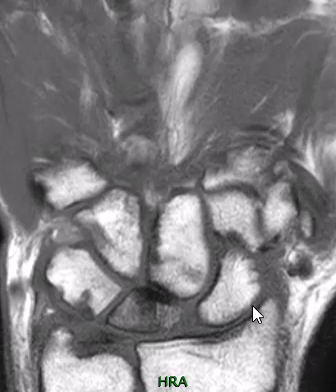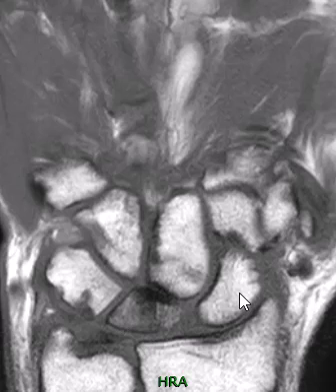And here is the lunate bone right here. So the scaphoid bone, lunate bone, triquetral bone. Here's the distal radius. Now, a lot of times we see the lunatomalacia associated with an ulnar negative variance. An ulnar negative variance is when the ulna is too short relative to the radius. Usually there's a little gap here that the TFCC fits into horizontally. And if the ulna is too short, then that'll cause abnormal pressure between the radius and the lunate bone and lead to lunatomalacia. But again, this is a neutral variant, so that is not the cause.